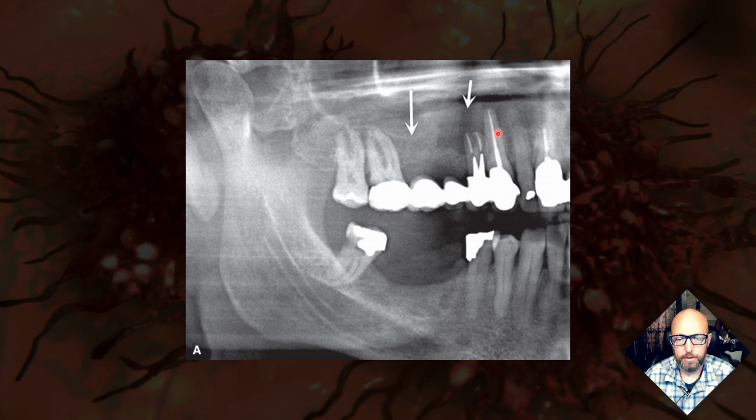It is an older patient. Maybe that's something that could clue you in, although carcinoma is going to be more common in older patients as well. But we said our non-Hodgkin lymphoma was the one that can affect the jaws, that can appear radiographically. And so non-Hodgkin is one that we're going to see in our radiographs. And that one affects more commonly elderly patients, very uncommon in young patients.